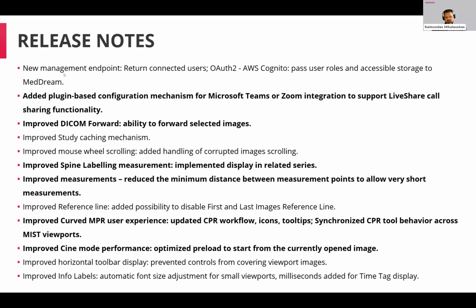We updated the management endpoint to return connected users information, and for AWS, we expanded to pass user roles and accessible storage to the MedDream and to open the needed study from the needed storage PACS. Then we improved the study caching mechanism.